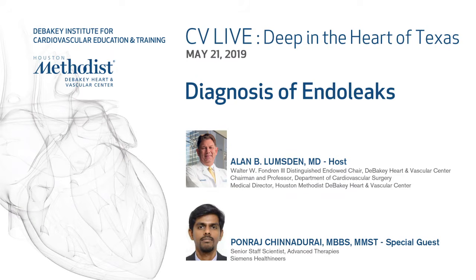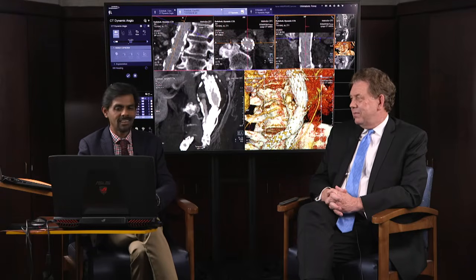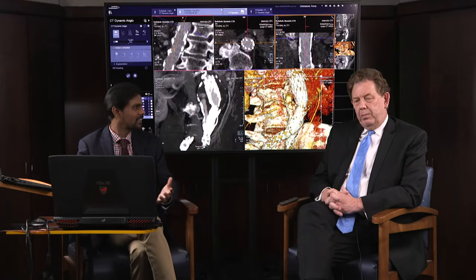Okay, so welcome back. Now we're going to delve into the meat of this presentation. Ponraj, over to you. Show us how we are going to interrogate this graph. All right, let's follow a protocol to go through and evaluate the data set.